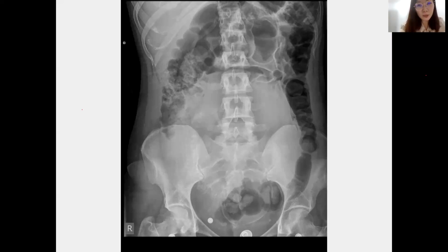LBO? The large bowel is prominent but not dilated. Not dilated. 3-6-9, now I can remember. So this is about 3. Just now somebody asked, when you measure, do you just look at it and take a ruler and measure from the X-ray? You must follow the scale, because I use digital, so I can always just draw a line and measure how many cm.